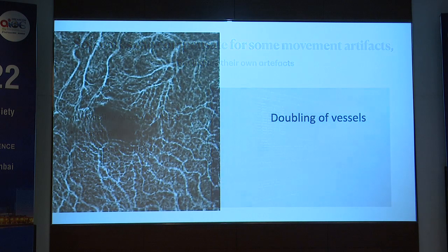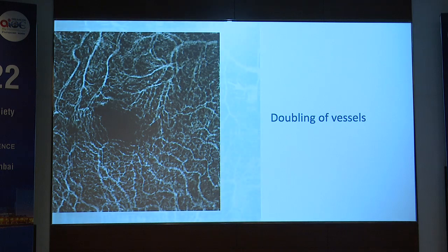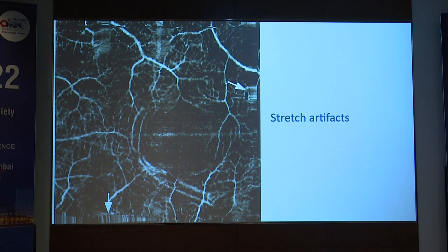So you can see this is doubling of vessel. That's a software related artifact. It's not because of the patient. Or if you see the corner, that white, there is some stretching which is happening. That's a stretch artifact. Again, because of the software.